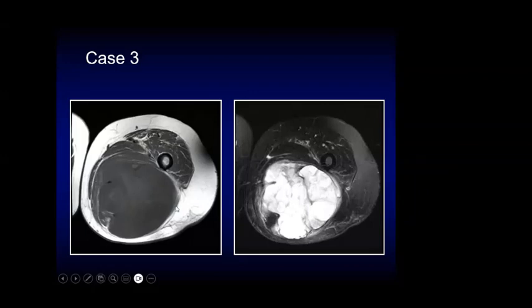Now, we talked about the neurovascular structures. So can you just remind me, what did you say about the neurovascular structures? Encasing, I think. I cannot localize it, but I think the one located posteriorly could be the vessel and encased by the tumor. Yes. These two. It's okay, far away from the tumor. Okay, so yeah, so this is actually not.